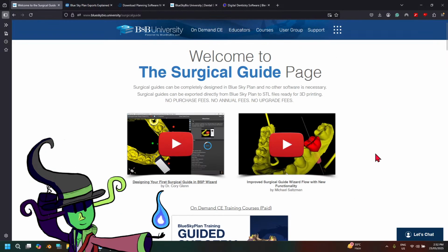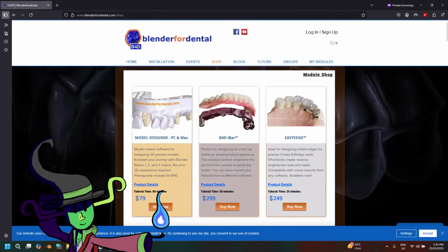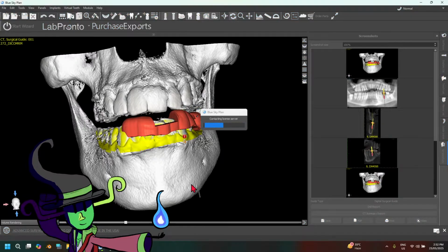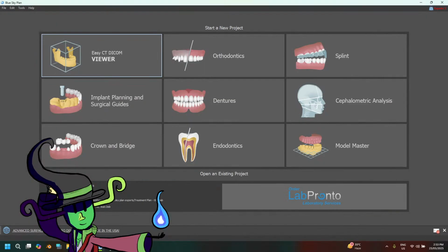I wanna test out another feature here, and that is create a new project here. Discard, please. Okay. Let's see.